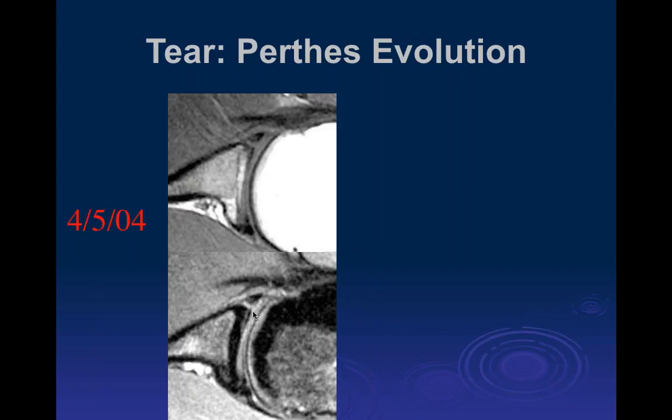Well, I don't see any abnormal bone marrow signal intensity of the glenoid itself. And regarding the periosteum, there's a little bit of a fluid signal gap between the labrum and the glenoid, but I don't really see distinct periosteal stripping. Yeah, and here's the normal, nice thin periosteal attachment. So this is an anterior labral tear, transverse tear, where the periosteal attachment is intact, which, and again, you can describe the periosteal attachment if you want. Again, to the surgeons I know, it doesn't matter. But when I see it, I usually describe it.